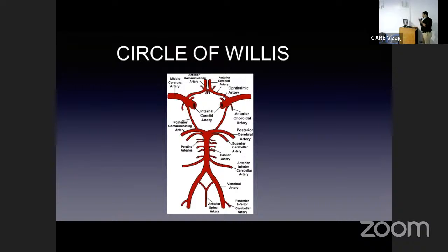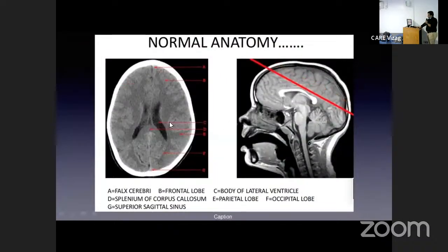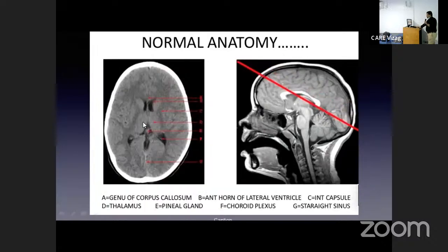It is important to know the vascular territories when you are dealing with the anatomy, whether it's an ACA infarct or MCA infarct, because sometimes you'll be seeing multiple areas of vascular territories being involved. In such a situation, you must understand whether it's an embolic phenomenon.